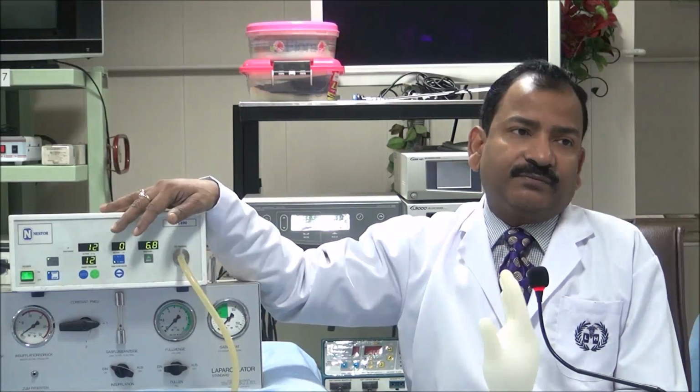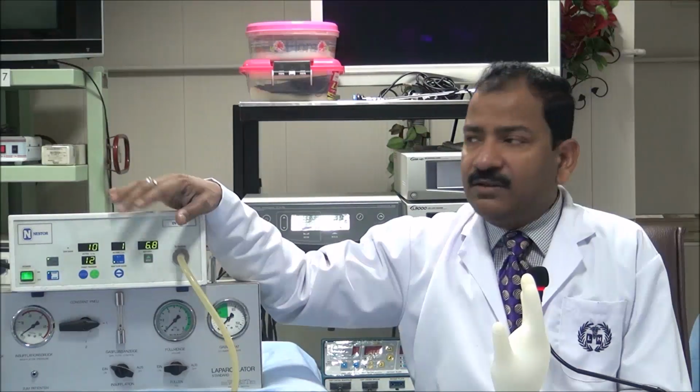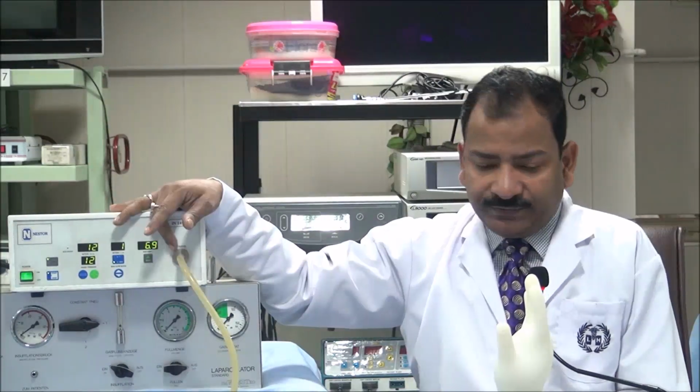So which one is good? This is good or that one is good? This is good? That is good. Reason why I am telling you. Remember, this manually what you are adjusting. In Stryker, when you increase the flow rate, what you are adjusting is not the flow rate. You are adjusting the maximum flow rate. If you are adjusting to 8, that means flow rate will not be 8. It will be maximum 8.